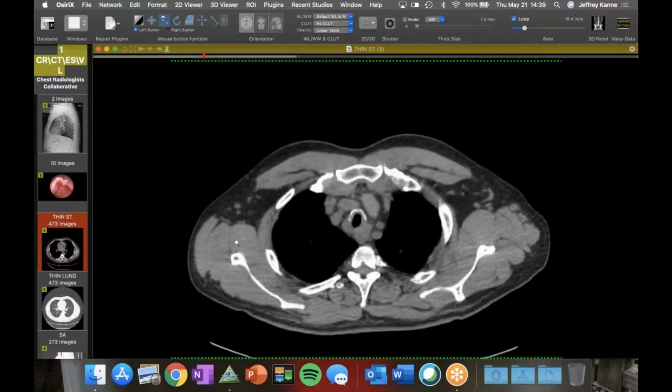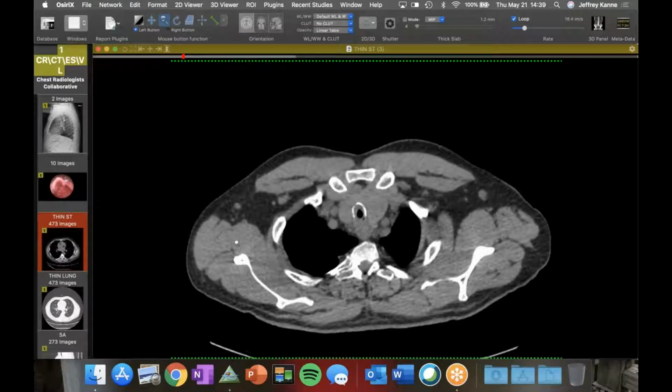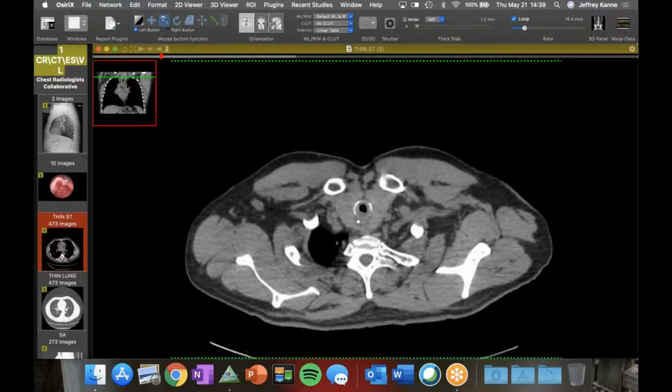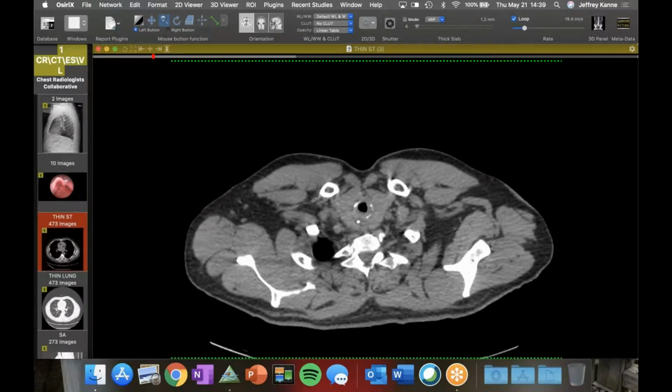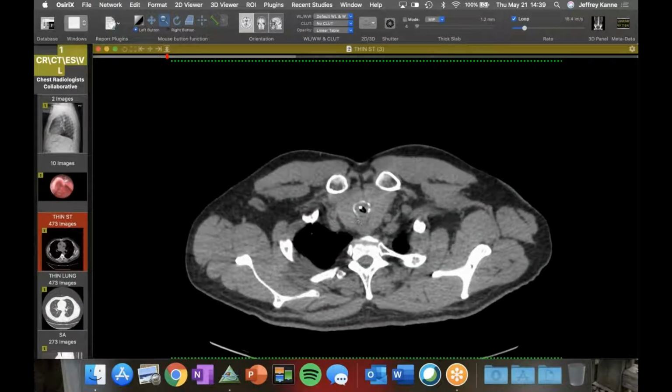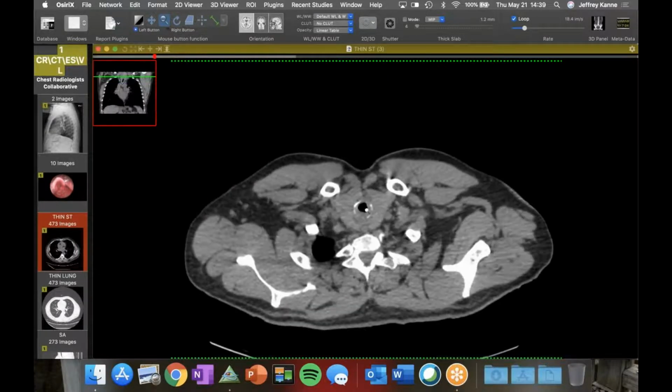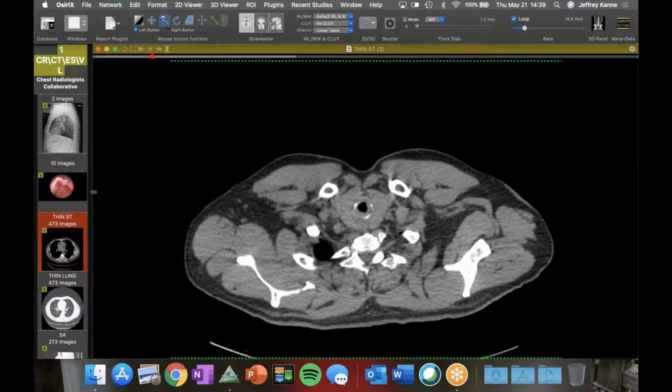You can recover non-caseating granulomata on biopsy, but we typically don't see this. I've only seen one other case of marked involvement. That's really rare. And you can see this airway is on its way out here. They actually had to do emergent airway surgery, a tracheostomy, to keep that open.